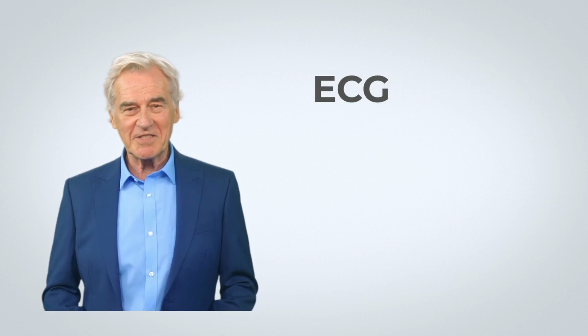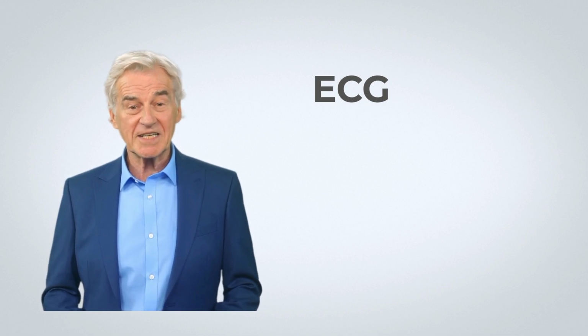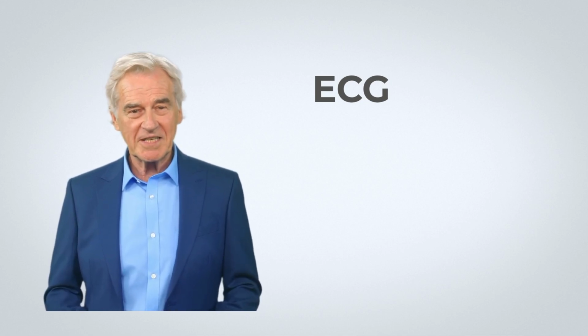Hello and welcome to this video on electrocardiography, or ECG. In this video, we will explore the different waves and intervals seen on an ECG tracing and what they represent.